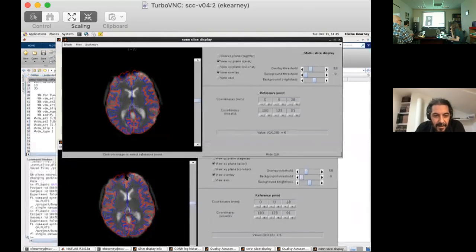And this sort of fits with, I was just looking up this tutorial that is provided by, I think it's Martinos at MIT, that I passed around, that shows how to use the SPM tool to do this using the gradient echo field maps that we get at MGH. And when you show the warp and unwarp side by side, this is about the level of difference that I saw. It's just one slice, one example, so it might be better for some scans, but this does look a little bit better.